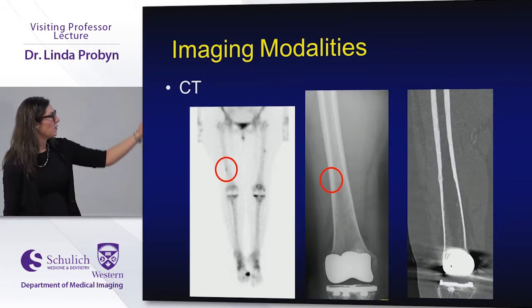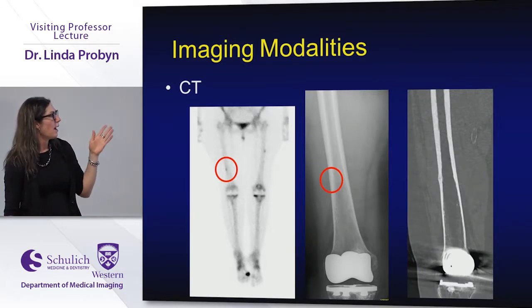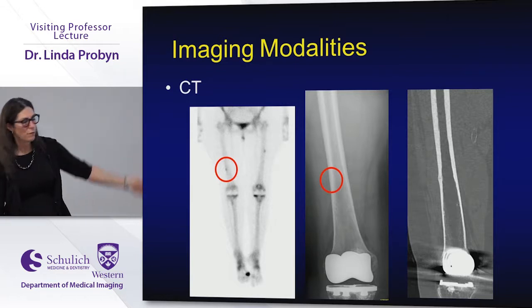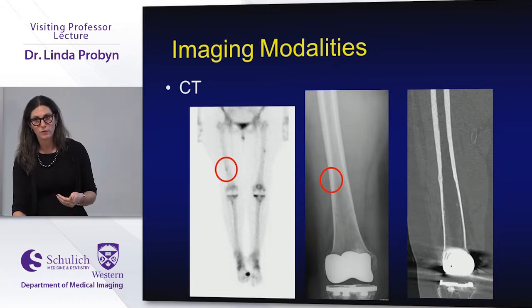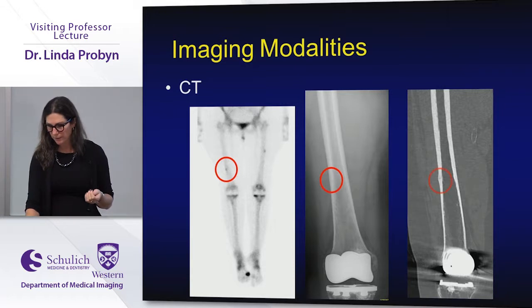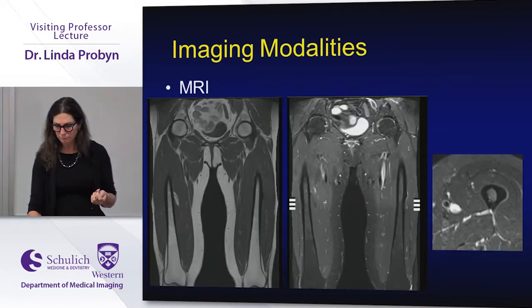And on the CT, we do thin slices, 0.6 millimeter, and we do reformats through it. So we're looking specifically there. In this particular case, we had some idea of where we were trying to find the abnormality. But on CT, you can certainly see these things quite well. Doing the coronal reformats, of course, is really imperative to be able to see these fractures. So there it is. I'll just mag that up for you a little bit.